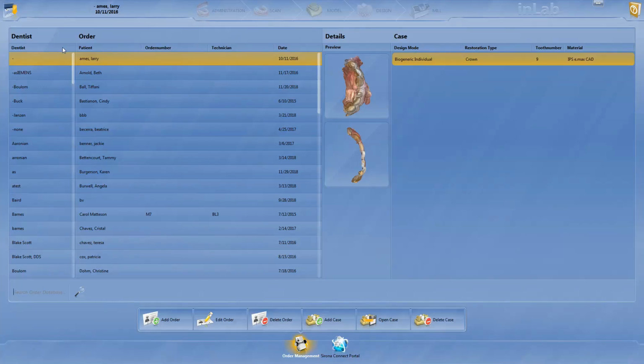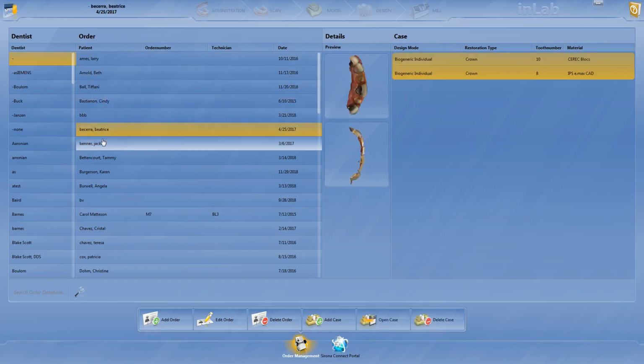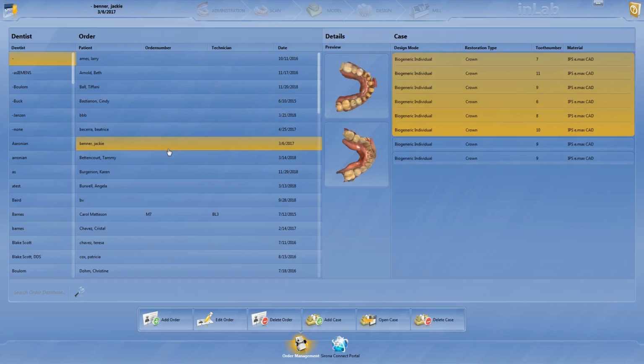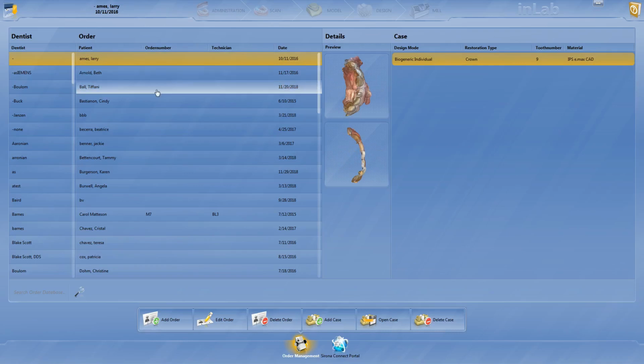Hey everyone, in this video I'll be outlining some basic techniques to make a crown appear more narrow, especially in the anterior region. In this particular case we're looking for a central, and that seems to be one, but I don't know if this gap will give us a good example, but let's just see what we can find. We may have to go with that one. Oh, there's one. No. Okay, well, we'll just go with this one for now.